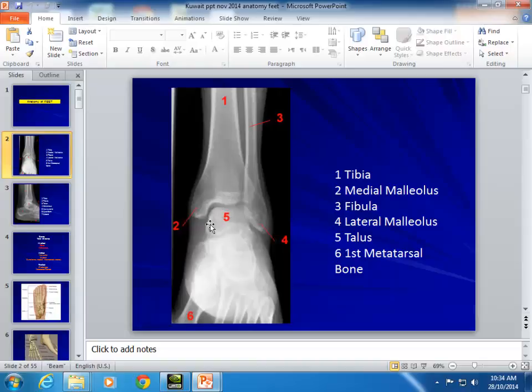I haven't got the anatomy of the talus in detail, but we'll see if we can go through the details, because this is very important, and most of the injuries, whether it may be impaction, OCD, or injury trauma, and what Gopi showed, the os trigonum, also depends on the age of the patient.